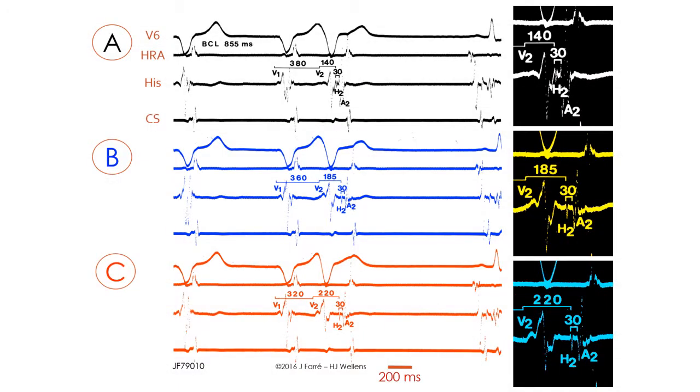These three panels belong to a patient that had a supraventricular tachycardia that was felt to be based on an AV nodal reentry mechanism. The three panels illustrate right ventricular programmed electrical stimulation introducing progressively more premature single ventricular extra stimuli. Note that each ventricular extra stimulus was retrogradely conducted to the atria.